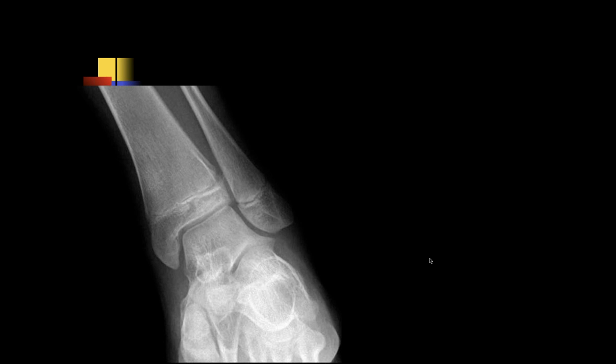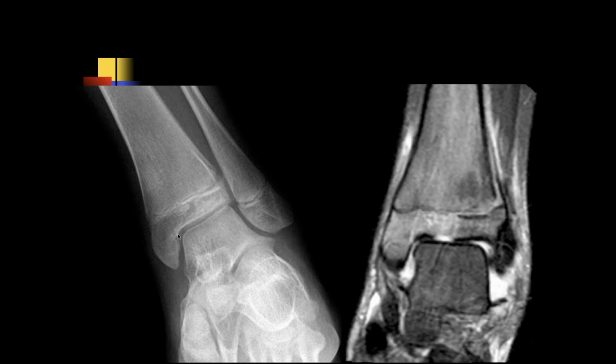Ashu. Another adolescent patient, open physis. I don't really see much. It could be some irregularity of the distal tibia epiphysis there. I don't know if there's a lucency extending through. There is, yeah, there is. The arrow helps. Yeah, so it looks like it's extending through inferiorly. I think this looks like a Salter Harris 3.